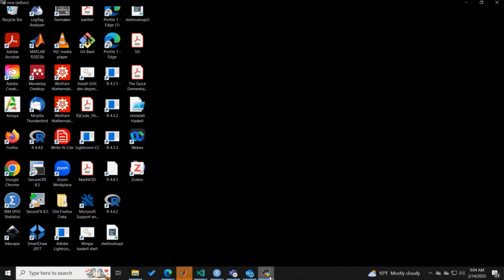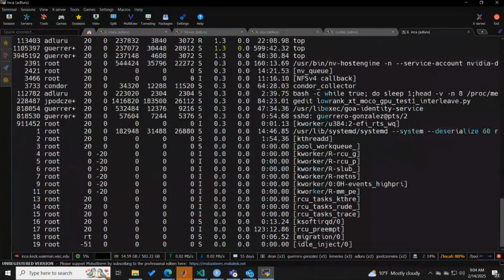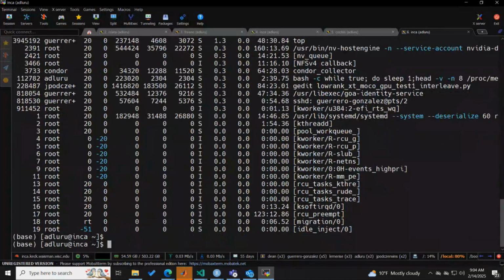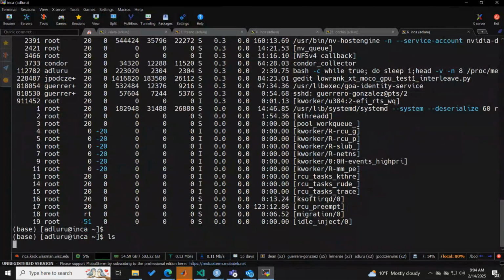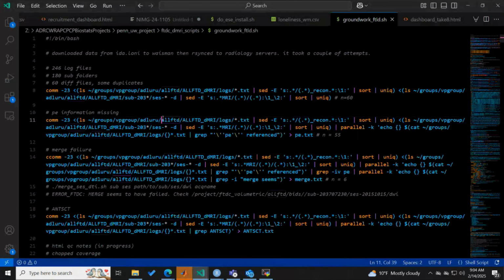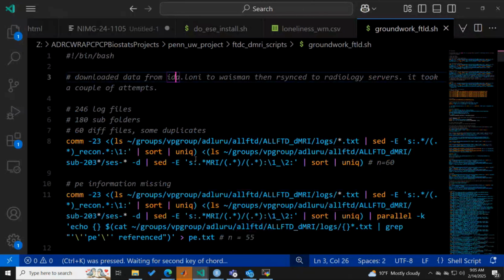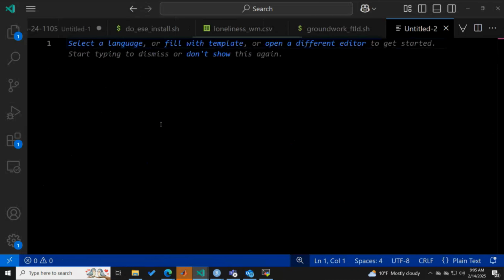So where are we? We extracted all of the thousands of connections with mrview. Perfect, that's right. Is this visible decently on your end? The font size looks great. Okay.